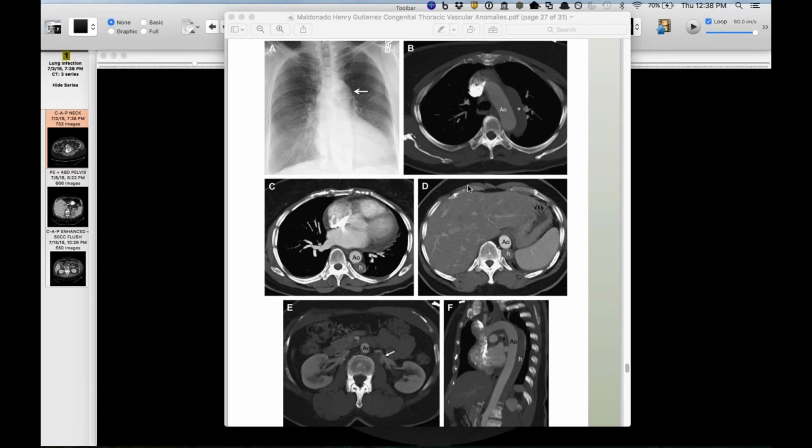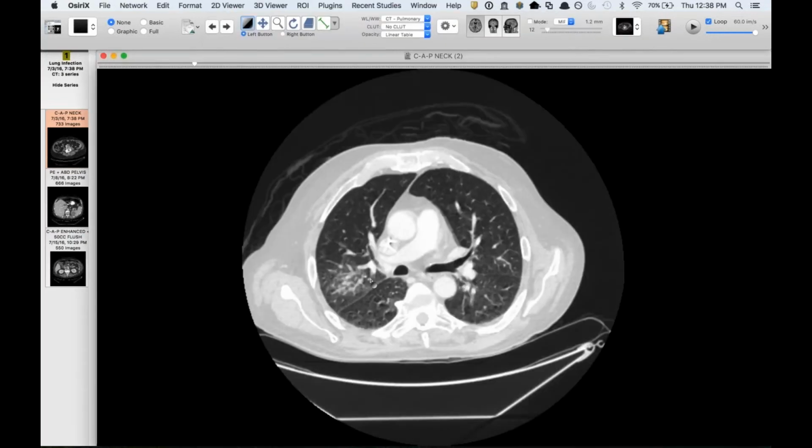But you know, it's funny because early on I saw this as a resident and assumed that I'd see more of that. But the one that Seth just showed is the only other one I've ever seen. So they're pretty rare. But I wanted to pull that up just to show that it looks very similar to his. All right, so I've got a bunch of infection cases mostly for Jeff and David, since they're the bug guys here more than anyone.